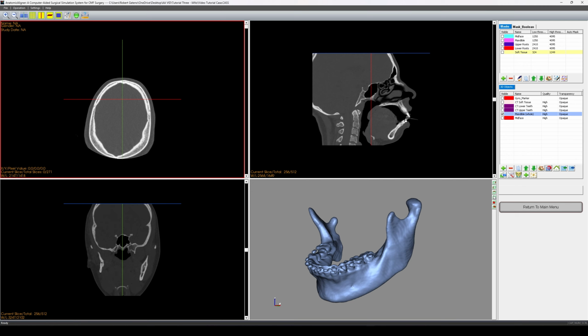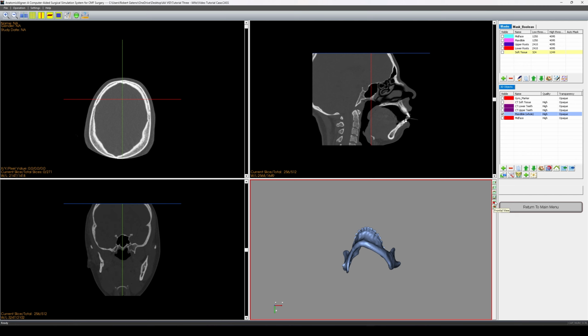To begin, I wanted to quickly go over these icons here to the right of our 3D model viewport. These are for our orthographic projections, so we have left, right, top, bottom, front, and back. With that, let's get into the creation of our IANs.